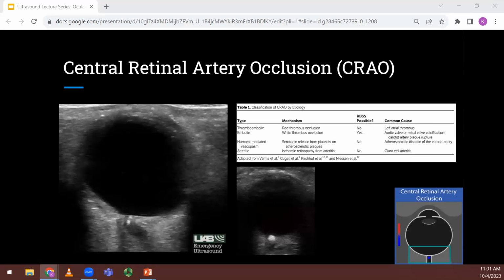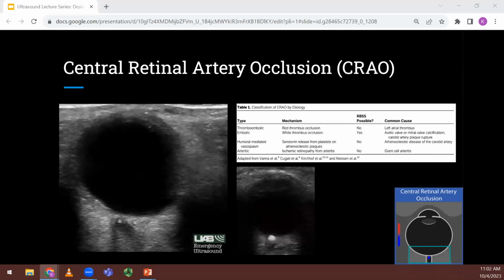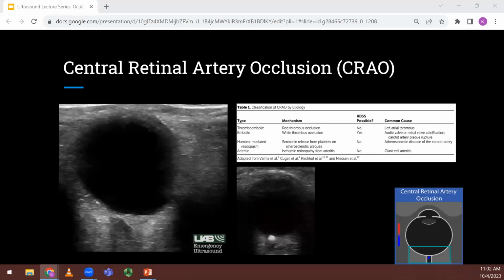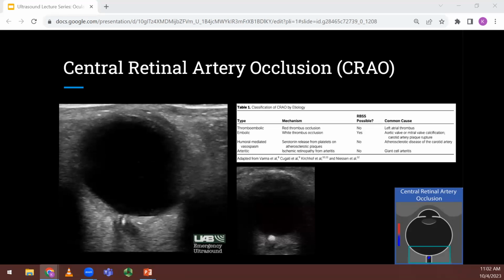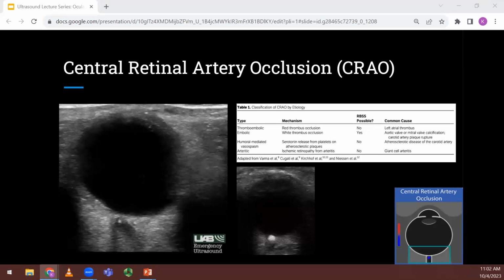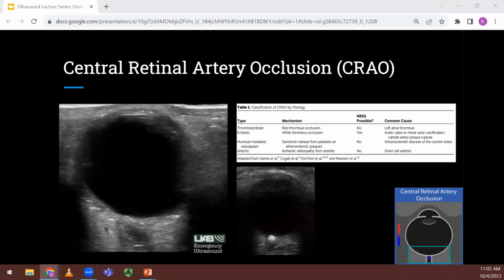If they have central retinal vein occlusion, that you can see pretty good, and you'll see blood and thunder. You'll see these very dilated veins with hemorrhages, and that'll tell you that's a central retinal vein occlusion. So that's where sometimes looking at the fundus can help you. Yep, I think I agree with you. Fundoscopy is way better than ultrasound. Ultrasound is not a good story for this at all.